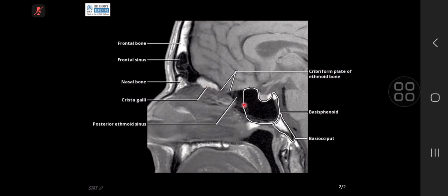So this is the pituitary gland, this is the clivus, and this is the sphenoid. So the sphenoid sits below the pituitary. Then comes the nasopharynx. A portion of the nasopharynx will be anterior to the clivus. But in our case, the epicenter was here. It was all filled up.